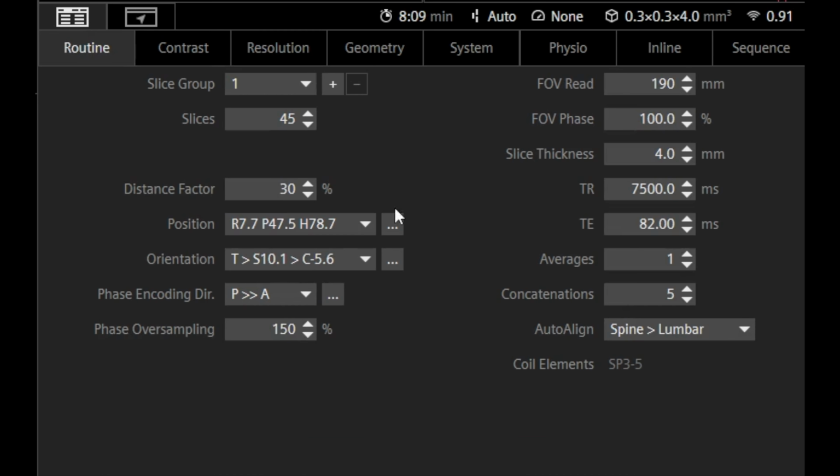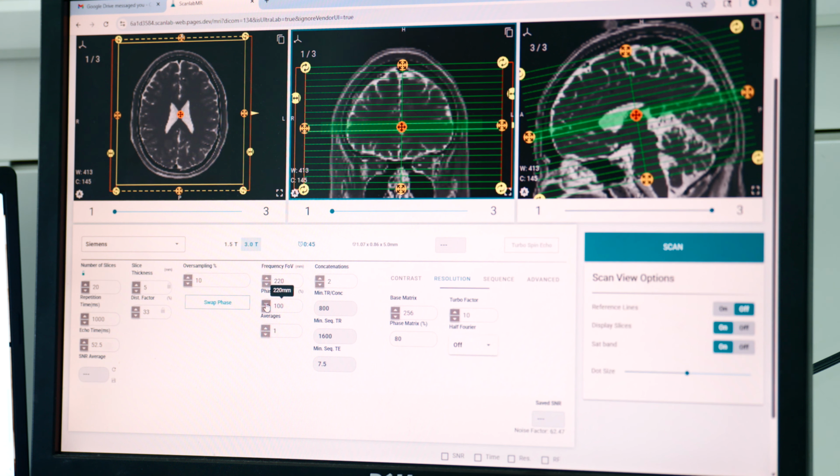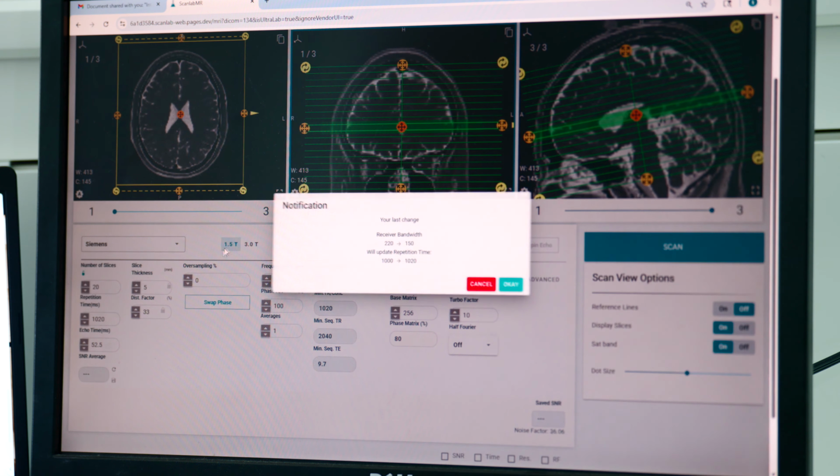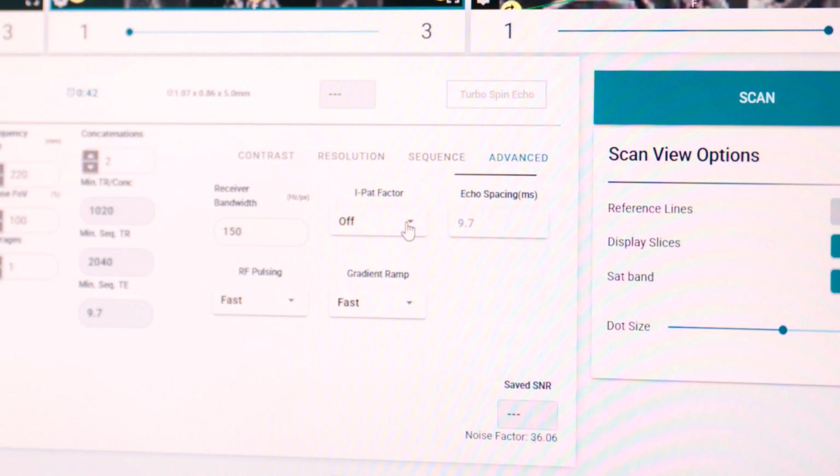Because in ScanLab, of how we acquire our data, we know ahead of time what each slice is actually made up in 3D space. And so in this case, now what I can do is manipulate these parameters and set a protocol. So on purpose here, let's go ahead and we will calculate, I don't know, at 1.5. Sure, we're going to change. I'm going to turn on IPAT, because this is parallel imaging.